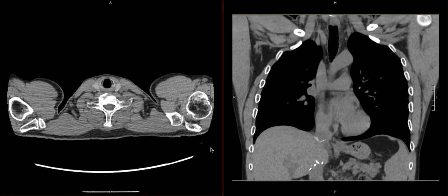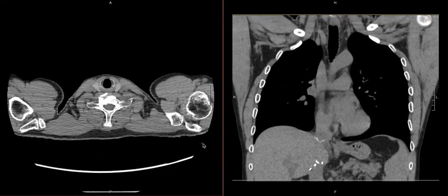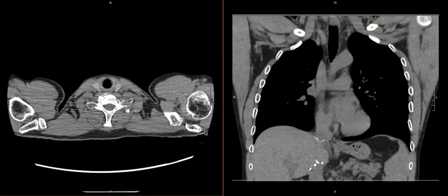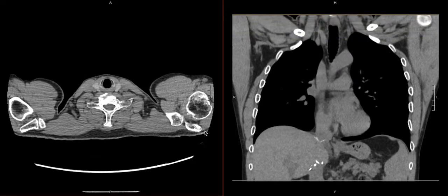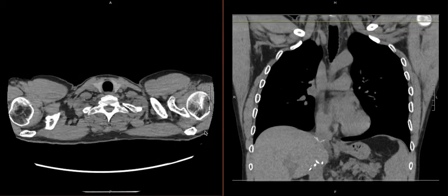Now we're going to quickly talk about looking at veins as part of your search pattern. Again, for a non-contrast CT scan of the chest, the amount of time and our ability to evaluate the venous structures is limited, but I think it is worth taking some time to talk about how you can see some of the veins and just building it into things that you keep an eye out for, because sometimes you can see important pathology even on a non-contrast study.